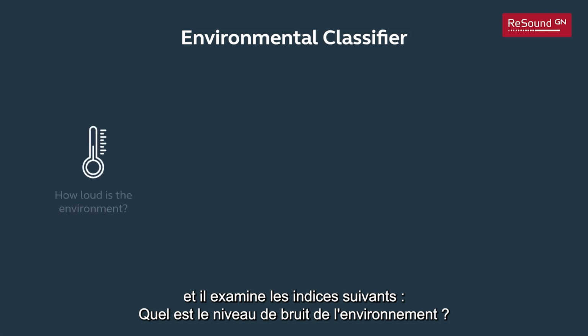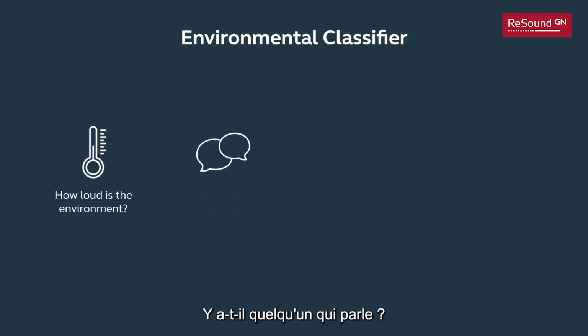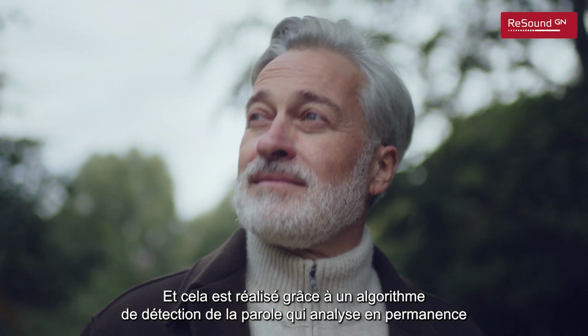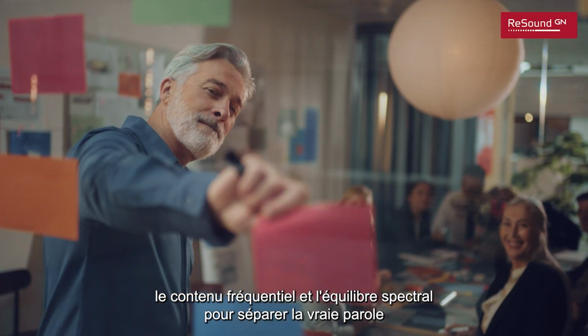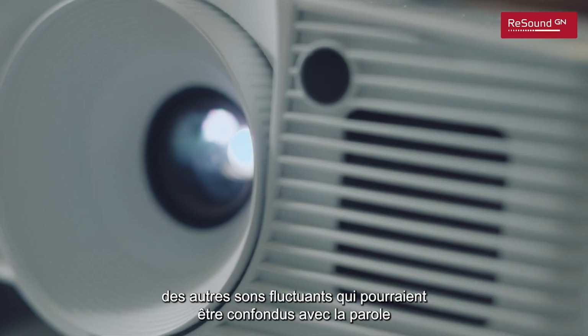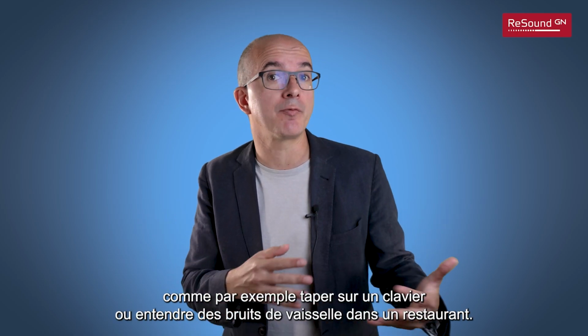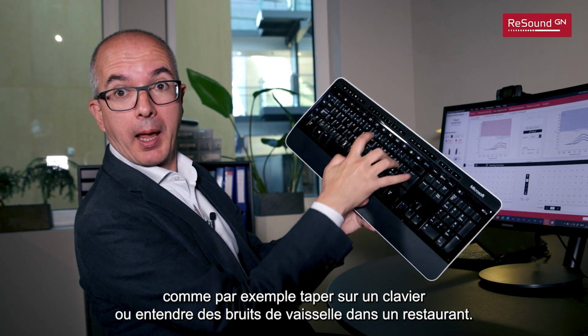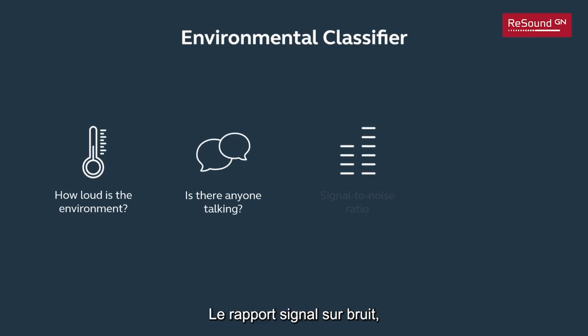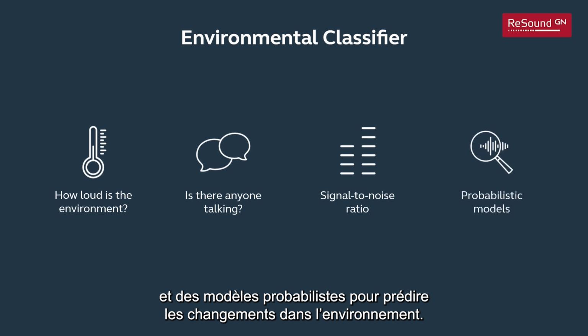How loud is the environment? Is there someone talking? And this is done with a speech detection algorithm that is constantly analyzing frequency content and spectral balance to separate true speech from other fluctuating sounds that could be mistaken for speech, like for example, typing on a keyboard or clinking sounds in a restaurant. The signal-to-noise ratio and probabilistic models to predict changes in the environment.